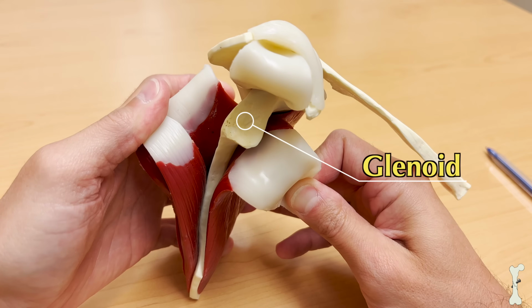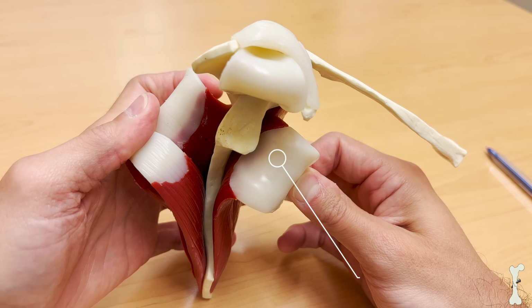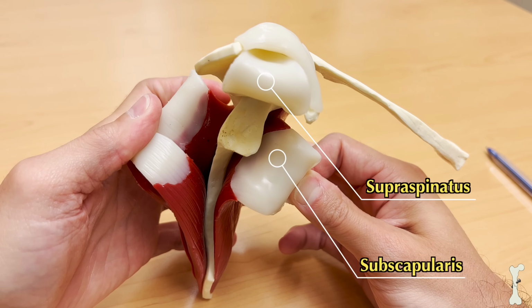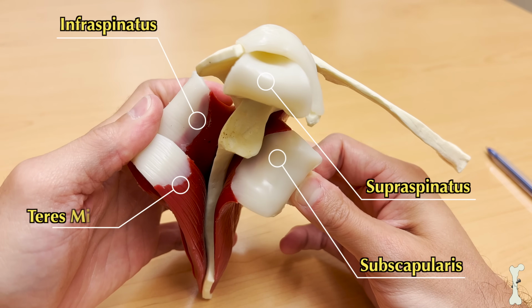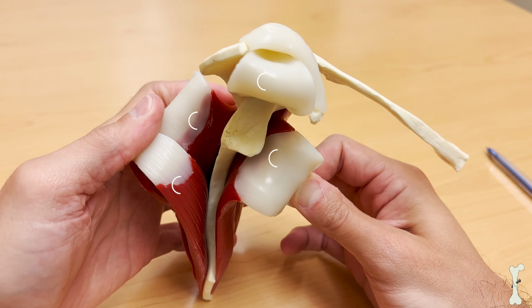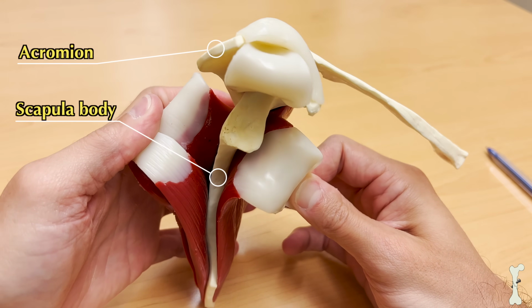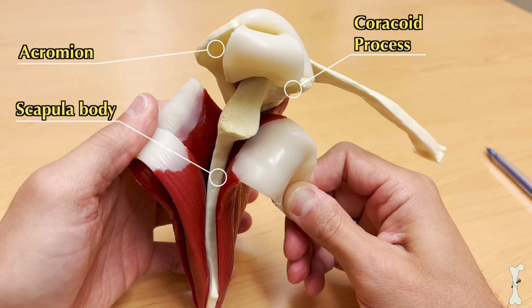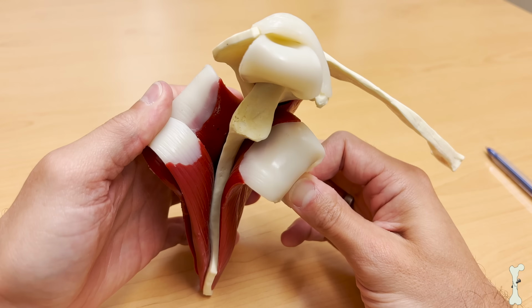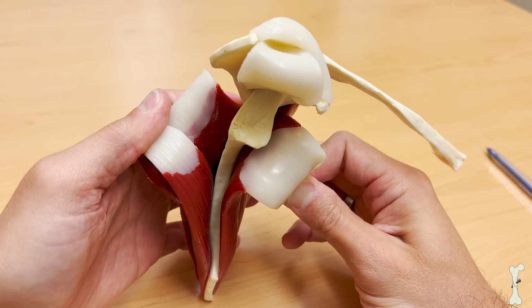looking down at a dinner plate. And so again, we can see the subscapularis along the anterior shoulder blade and the supraspinatus, the infraspinatus, and the teres minor along the top and the posterior aspect of the shoulder blade respectively. We can see the body of the scapula, the acromion, which is a part of the scapula as well, and the coracoid process along the anterior aspect of the shoulder blade. And so this will be a critical view when interpreting the sagittal MRI scan.